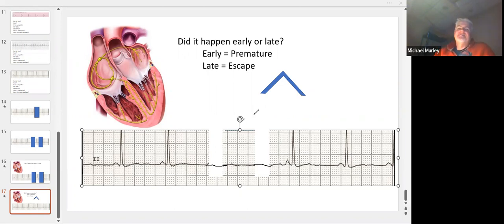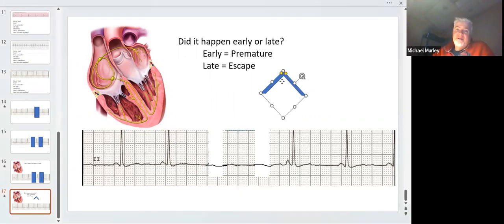So in this case, we'd say, okay, this is a sinus rhythm. And literally where those messed up spots are, I just put my hand over them. Let me look at it. Sinus rhythm, and this would be a sinus arrest, because we have a pause that's greater than two missing complexes.